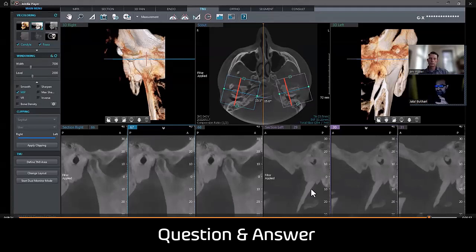So, we want to be careful in mentioning stylohyoid ligament calcification, because a person can have an elongated styloid process and give off the impression that this could be a stylohyoid ligament calcification. There's a very faint line that you may be able to notice on imaging, which distinguishes the process from the ligament. But if you wanted to localize where that ligament actually is, it's just posterior to the TMJ region, to the condylar head and the ramus. And right now we're scrolling through it. We can see the process right there.